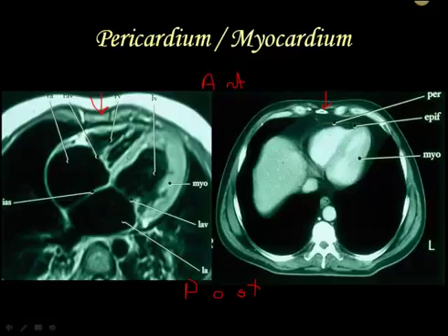Now the MRI is not in a complete axial projection. In other words, the patient's laying flat on their back, and what you are looking at is almost like a slice of bread out of a loaf. This is actually angled some. And the reason that I know this is that we are seeing the entire septa from one side to the other. Now, the heart is not in a perfect, orderly manner. You know that it is oblique, and it sort of tends to tilt downward inferiorly from over to the atria to the ventricles. So that's what's going on here.